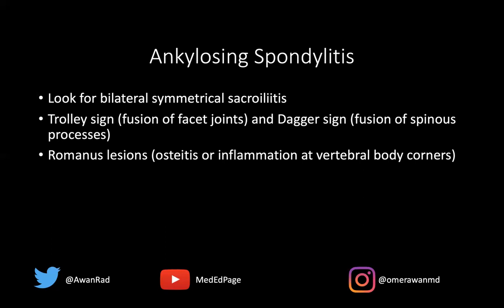And these can be precursors to something known as syndesmophytes, which are seen only in ankylosing spondylitis and IBD arthropathy. These are not seen in psoriasis or reactive arthritis, right? This represents ossification of the annulus fibrosus of the intervertebral disc, right? We see perivertebral ossification, which is different in psoriasis and reactive arthritis, but syndesmophytes, which is a key finding in Ankspon and IBD arthropathy, are seen in those two diagnoses, right? And they reflect ossification of the annulus fibrosus of the intervertebral disc.